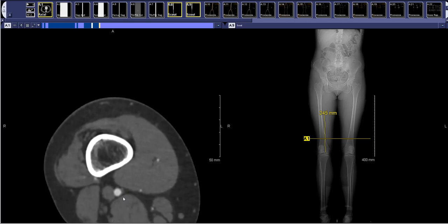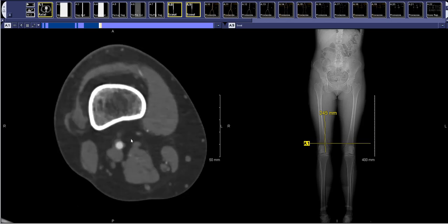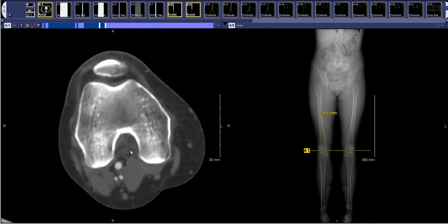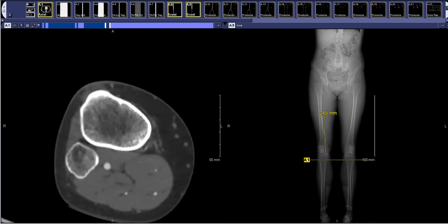So here's the popliteal artery. Popliteal arteries are frequently affected by stenoses and aneurysms, especially in vasculopaths, so it's always important to look specifically there. As we keep going down, we get to the level of the knee joint, right here, and all these perigeniculate collateral vessels arise off of that popliteal artery.